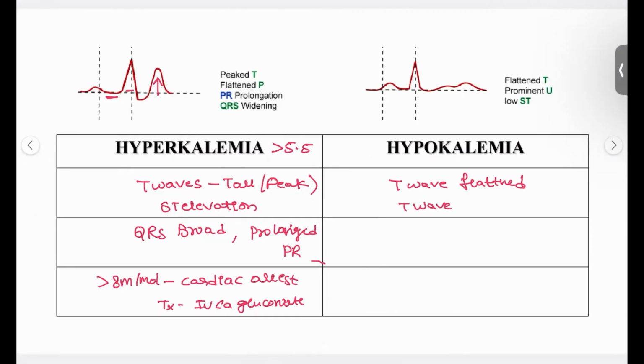seen. All right, T wave depression is also seen, and as we discussed beside the slide, there is a prominent U wave, right? There is a U wave also present. And how about the QRS complex? There is usually QT prolongation. Here you can see there is a QT prolongation, same as your PR prolongation. The PR interval is also prolonged.